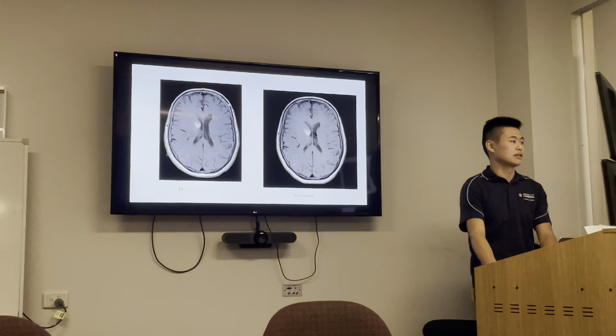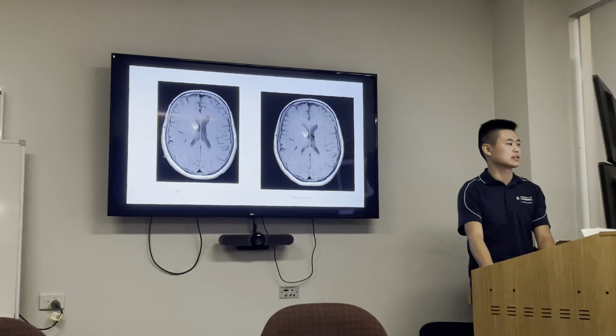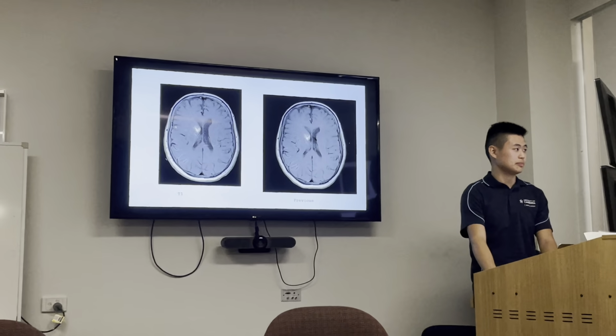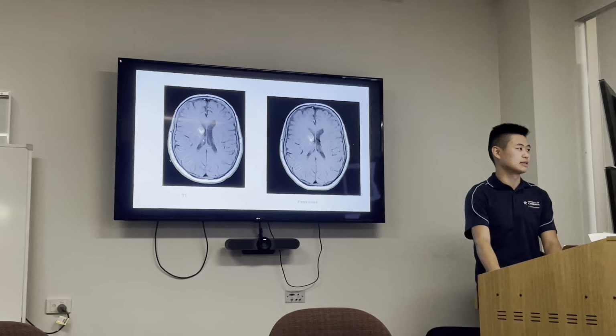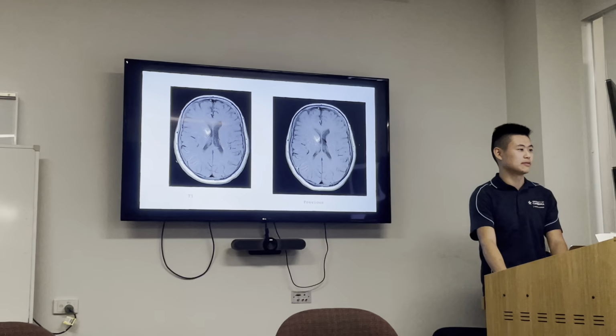So this is a T1 from the patient, and this is the previous one of the patient as well. This is actually just a catheter they placed in. There are changes in the ventricles, and this little lesion just over here differs from the previous one.